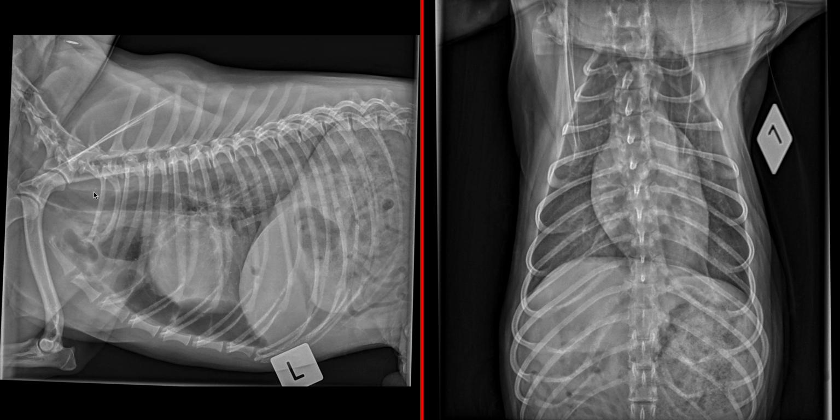There is increased serosal contrast in the mediastinum, which heightens our ability to assess the margins of the trachea. We see gas tracking along some of the great vessels. Additionally, in the cranioventral mediastinum, we have a more heterogeneous appearance of both soft tissue with small gas foci. This is consistent with both a pneumomediastinum as well as suspected mediastinal fluid, which likely represents hemorrhage.